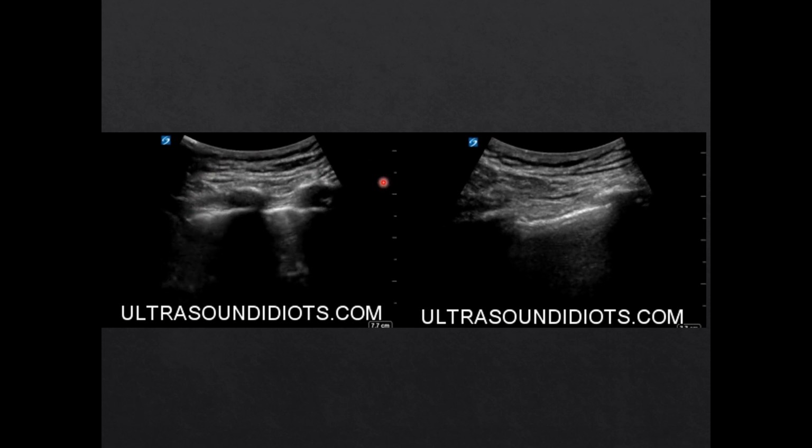On the left here is a normal lung ultrasound. On the right is one with a pneumothorax. Just to orient ourselves, we have the layer of skin, the same on this side, various soft tissue, including muscle, and then right here with the shiny top and the dark inside with shadow behind it, these are ribs, and you see the same on this side with rib shadowing as well. This bright line is the pleural line, so the parietal pleura would be right there.